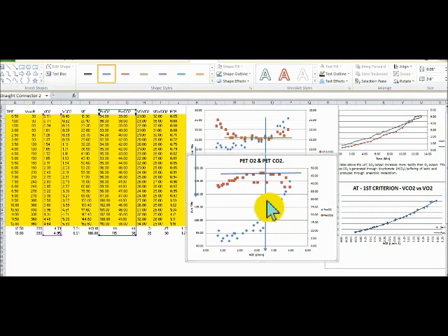And we see where the line of increase for the PET-O2 and VeVO2 happens right at the point of where that nice level is for both lines. Okay, so let's see.